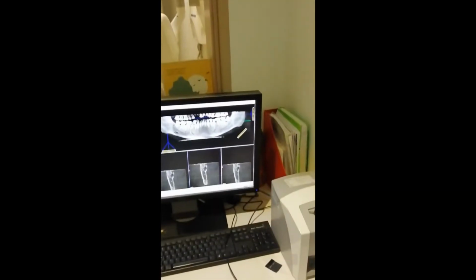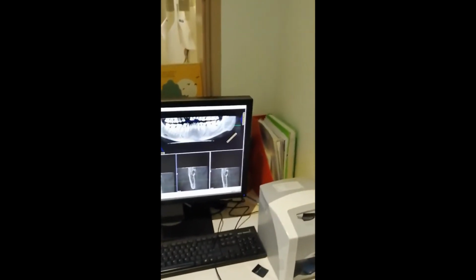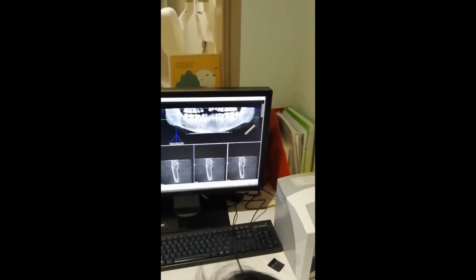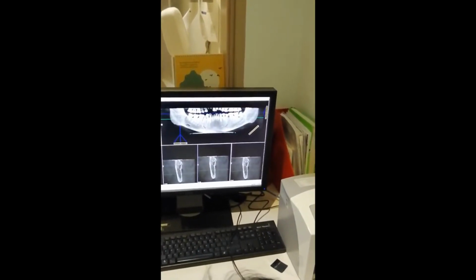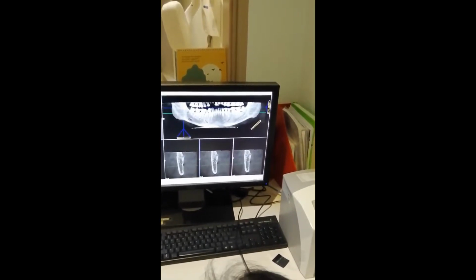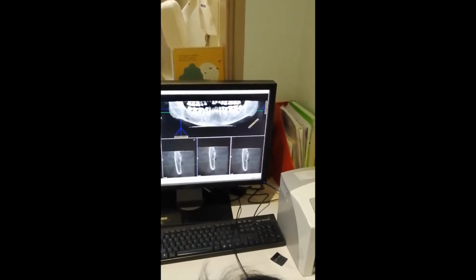See, there is a circle here. That means it is highlighted. Okay, so what I'll do, I'll come down further. I'll keep clicking. See, this is called manual measurement. Okay. See, like this.